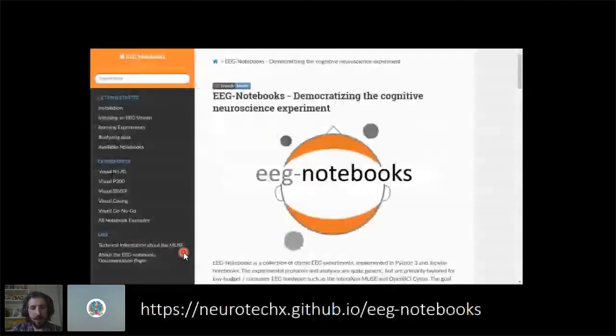So here's the link. This is the tool. The link there is to the documentation pages. There's also a GitHub repo, which is where the code is that is linked to from the page there. I like my corruption of the Jupyter logo there. I hope they won't sue me for it. Interesting question. Let's see how it goes. Because it's an EEG, you see, it's got the nose and the little ears. That's what EEG topo plots look like.